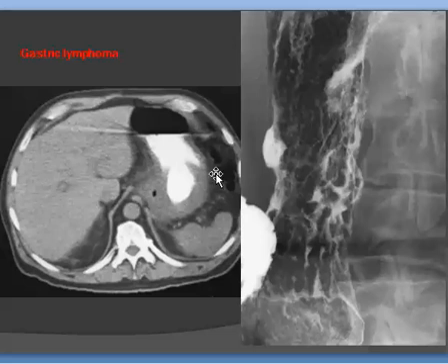Gastric lymphoma, again with a large extragastric mass and limited distensibility of the region of the body. Here the whole stomach is involved with coarse gastric rugae with irregularity and ulcer formation. So we have ulcer, we have irregularity, nodular appearance, and we have a long segment of involvement of the stomach, mainly by nodular and irregular mucosal elevations with ulceration. This is lymphoma.